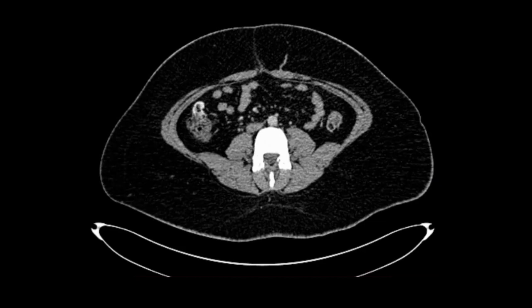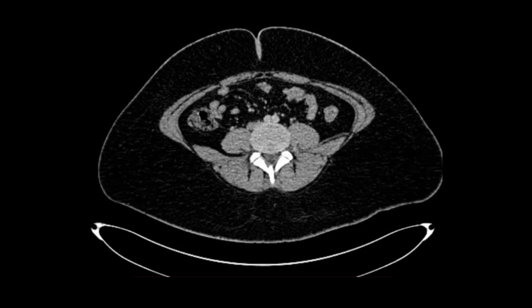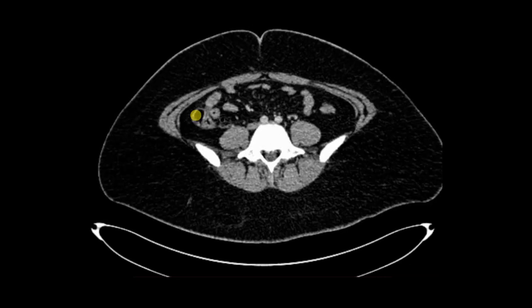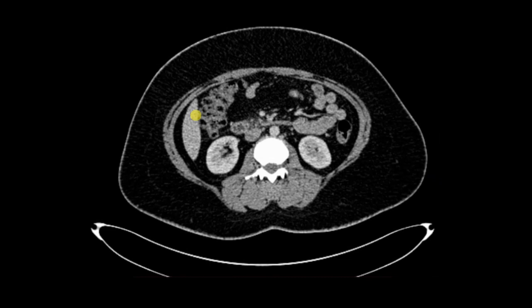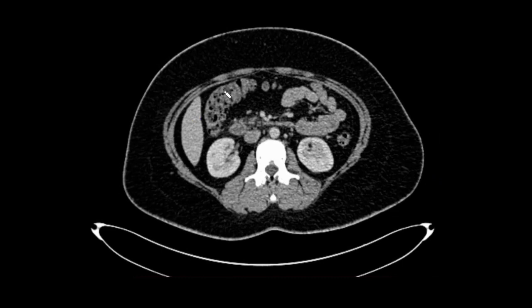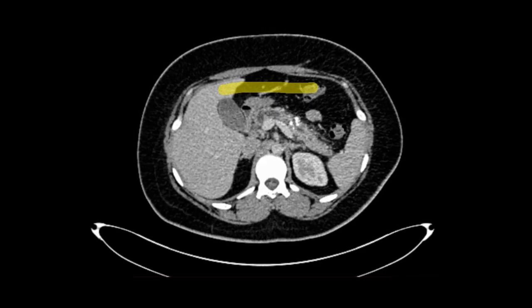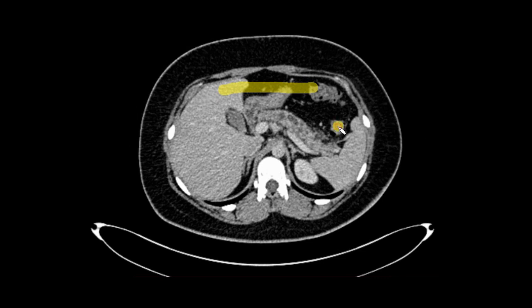Just to revise, you can follow it from any direction, but I like to follow it from the anal canal upwards. That is how I follow it. Otherwise, you can start with the cecum, and continue following it. Cecum, go up, that is the ascending colon. Once the liver comes, that is the hepatic flexure. Then you have the transverse colon, and then the area of the splenic flexure.